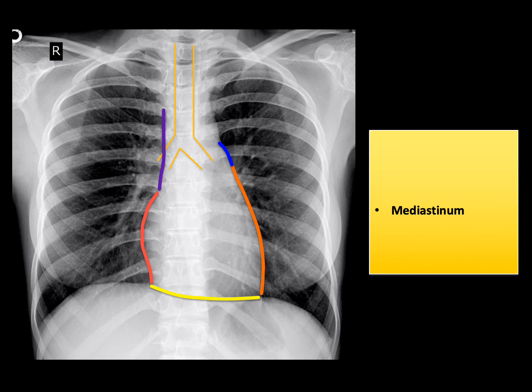Okay. So how do you look at the aorta? So this is the aorta, and you can actually trace its lateral margin all the way posterior to the heart. This is the shadow of the aorta that we see over here.